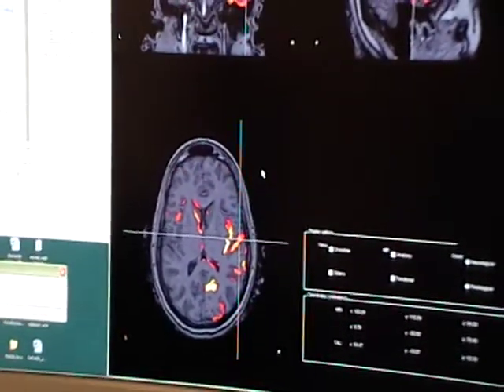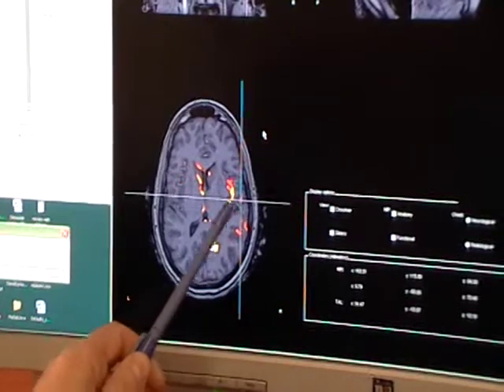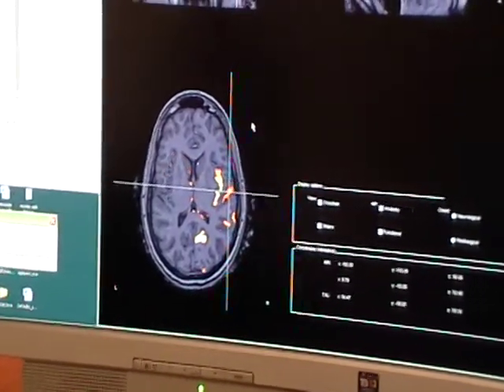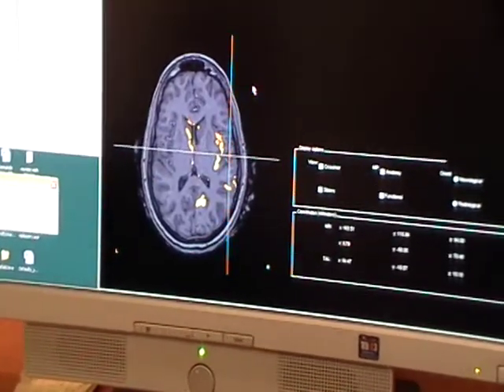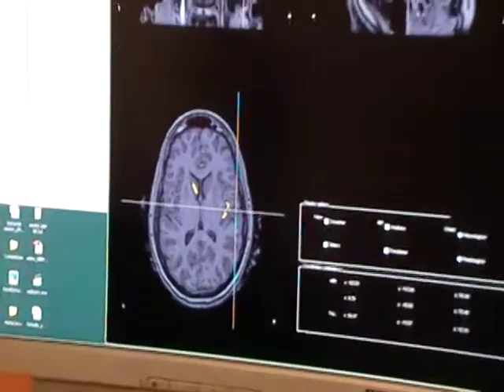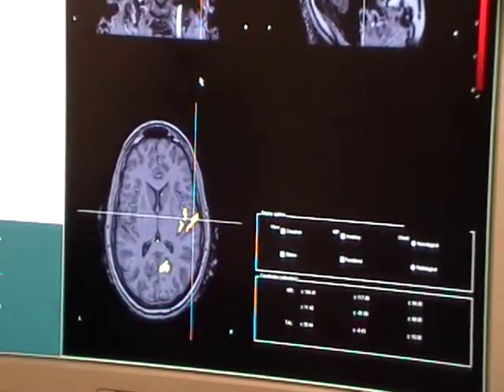So here I'm going to change. What we see is basically a movie of the epileptic activity that tends to propagate from this hotspot here to the rest of this patient's brain. And every image we see here is half a millisecond. So this is a virtual movie of the epileptic activity in this patient's brain every half a millisecond, every 500 microseconds. Here timing is very crucial, just because we want to be able to go back to the origin of the epilepsy, and so we want to be very accurate in terms of timing.